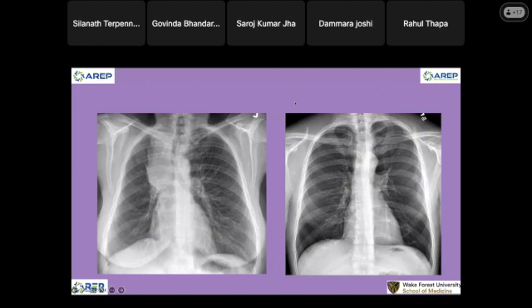That is the upper trachea, and this one is a big mass. Do you see anything deviated here? Is there a tracheal deviation on the right side? Normally, the tracheal air column should be right in the middle. Good. So we see a big mass here pushing the tracheal air column to the right.